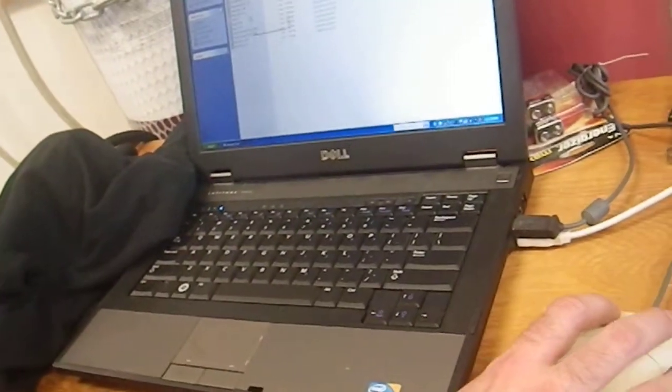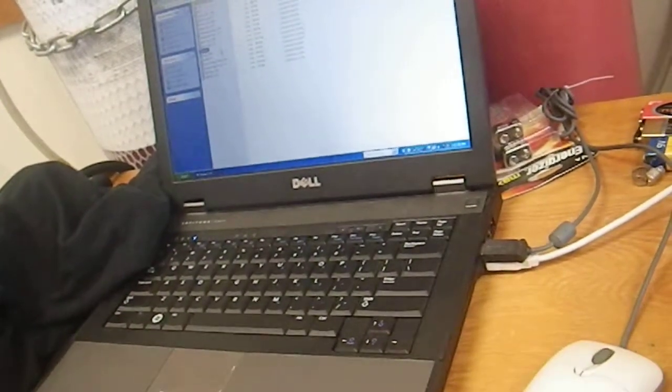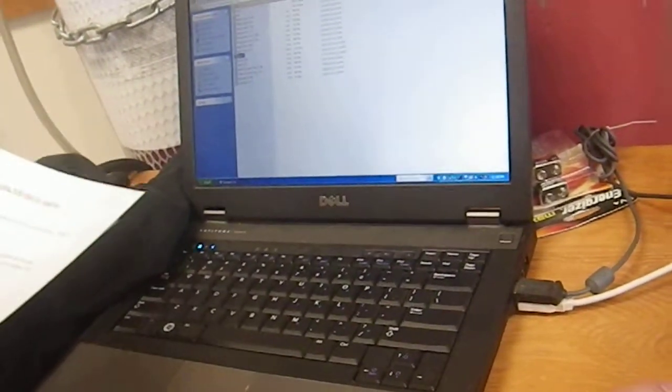In the folder for this specific file we just did, you go here and we have test. You have these three files, but none of them are text files, and no program can read these files except for that one. So what you have to do is export it.